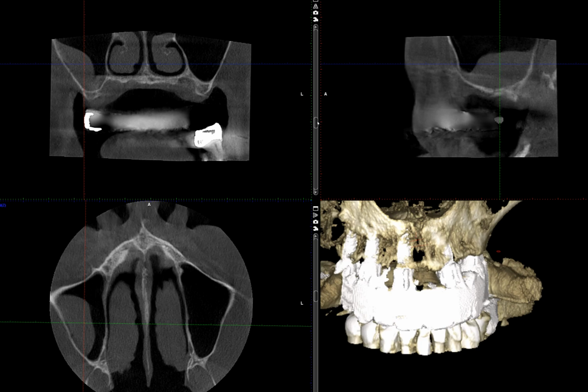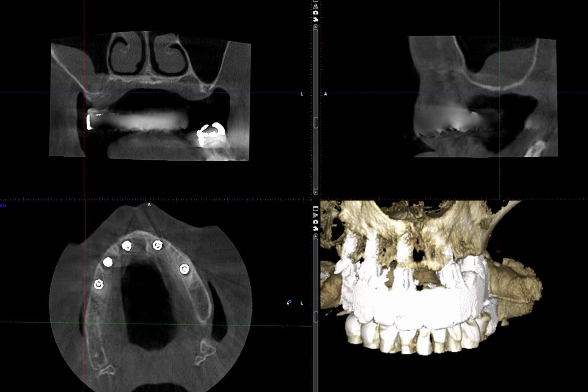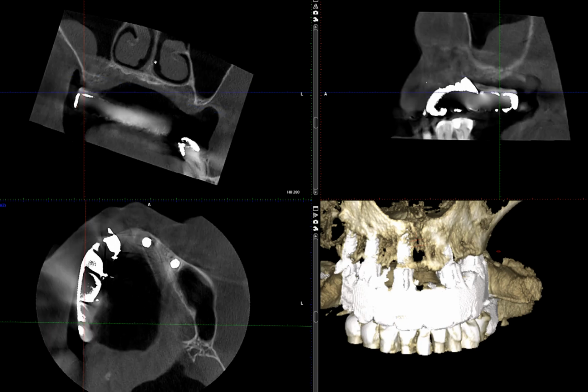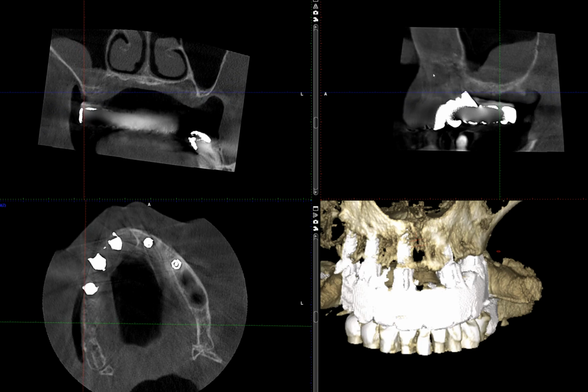And most of you will encounter this mucous retention pseudocyst on your panoramic radiograph. While I cannot completely recreate how this would appear on a panoramic radiograph, if you look at this sagittal section, I think it's going to come pretty close. You're going to see the posterior region of the right maxilla, the floor of the maxillary sinus, and this dome-shaped radiopacity on the panoramic radiograph.